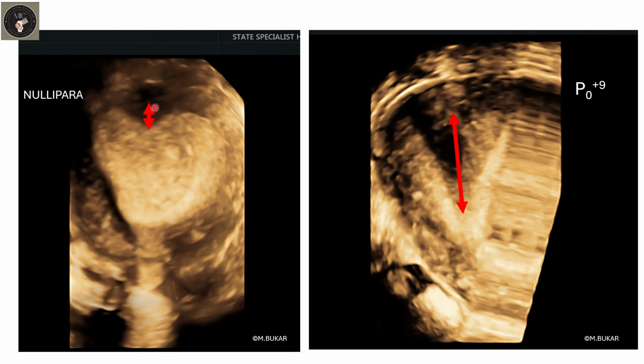Look at the depth of indentation here, it's less than 10, while the depth of indentation here is more than 10. So this is arcuate uterus, while this is uterine subseptum. Why subseptum? Because the septum has not reached the internal os.